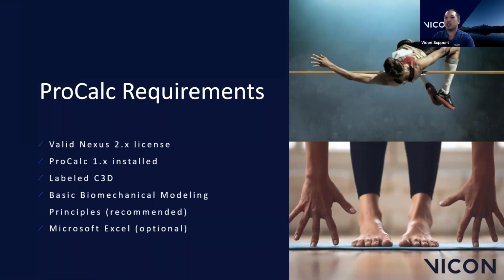You don't necessarily need a good template or anything like that, but the markers do need to be labeled within your C3D. It would be helpful, obviously, if you did have some basic biomechanical modeling principles, because we will be doing things like creating segments, calculating Euler angles, and that kind of thing.